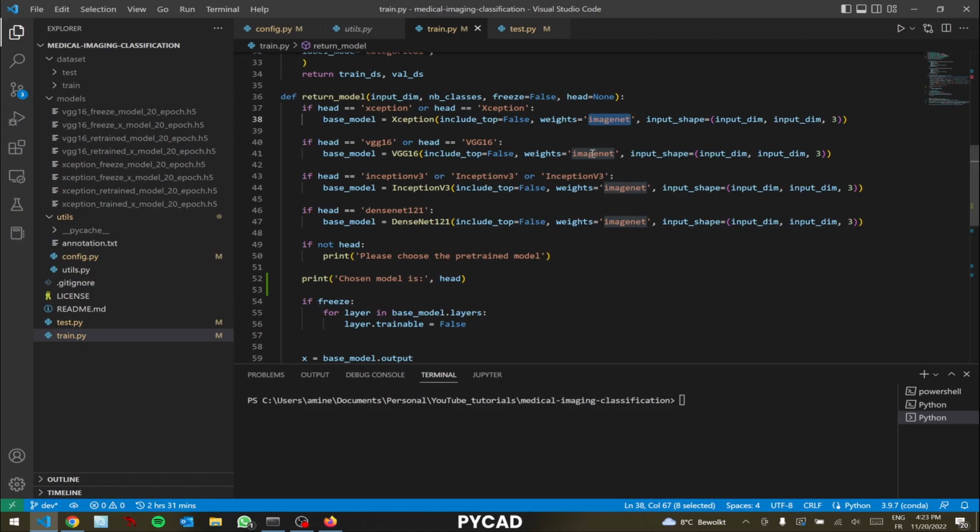So if, for example, our model has been trained to detect circles, rectangles, or any kind of these shapes, because we have a lot of convolutions happening there, these are big architectures, so we have a lot of features inside them. But we can choose to not change them. If you load your weights here, you can choose to not touch them.